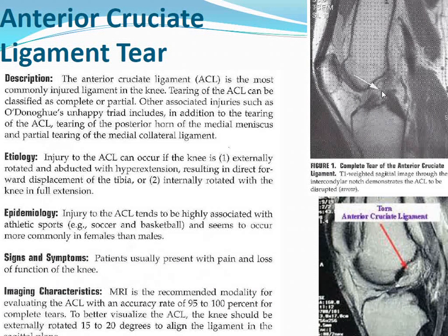It can either be torn in the middle, it can be pulled off the bone at either end, or it can be just partially torn through the middle, or it may just have some abnormal signal from a really major stretching.